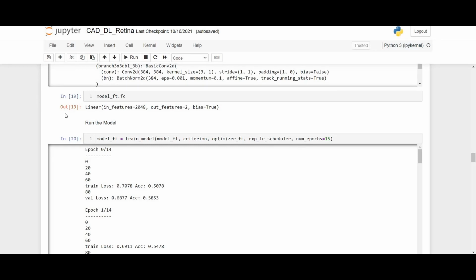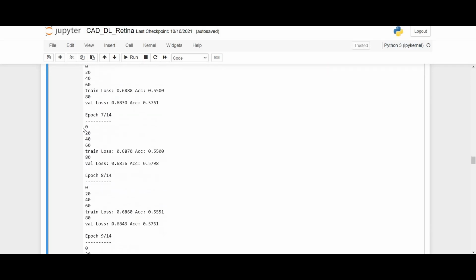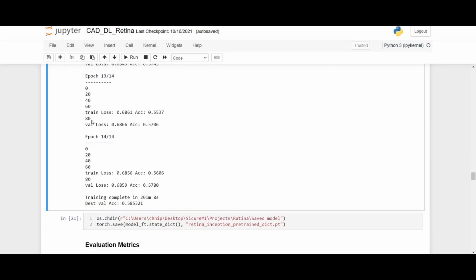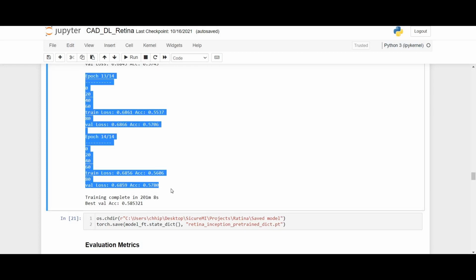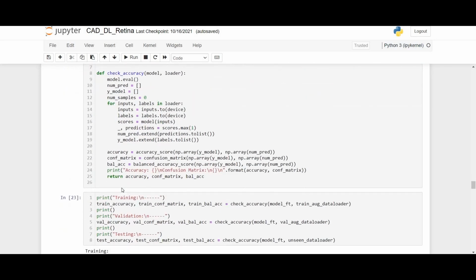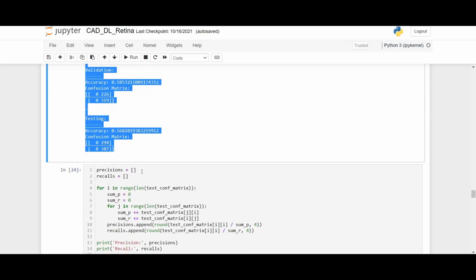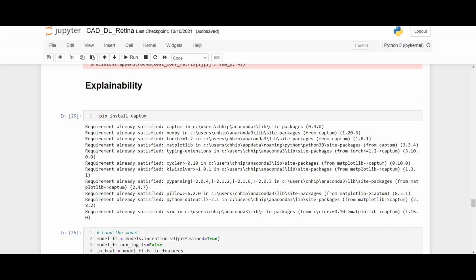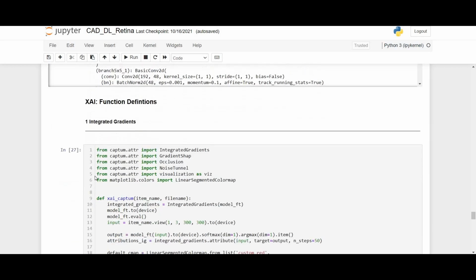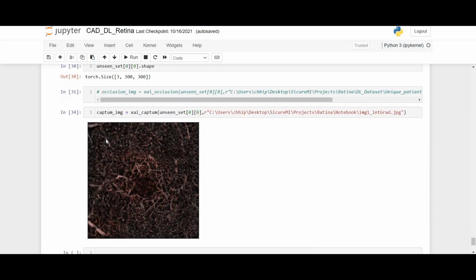For the performance of the deep learning model, we can see the training epochs, training, validation, and test accuracy of the model. We can also have a look at explainable AI. In deep learning, where researchers cannot explain why the model arrived at a particular decision, the explainable AI helps to understand, interpret and trust the predictions made by the AI models.